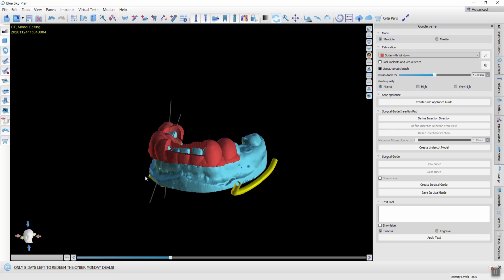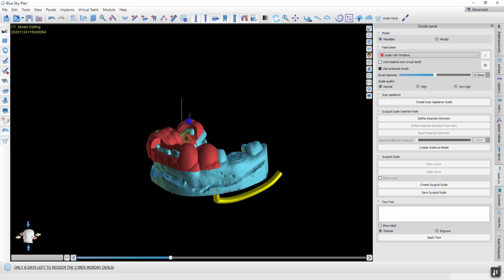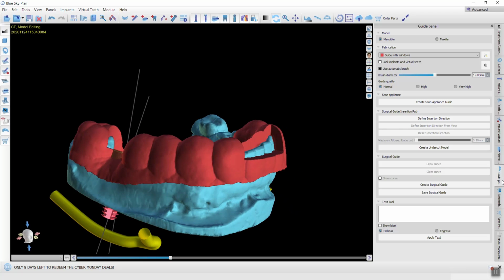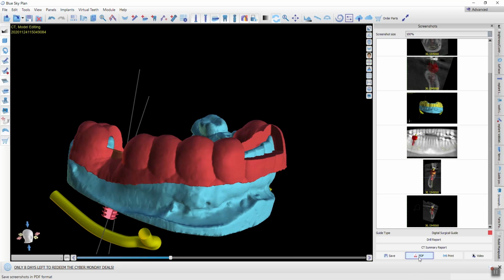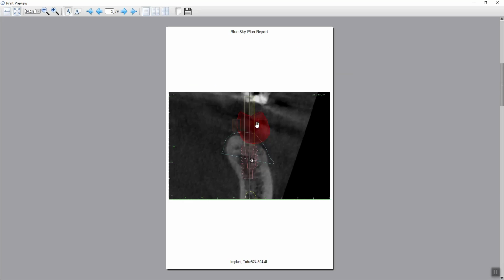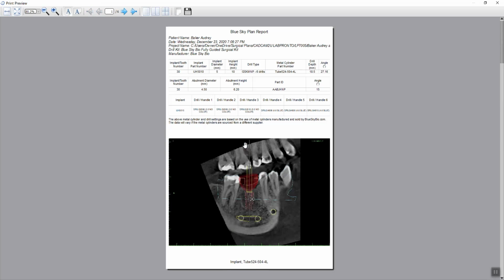So this is a pretty complete case, and I don't really know how long the video is, but I hope that this works for you guys. Oh, I forgot the drill report. As always, you have it here, and this is the Blue Sky Bio drill report.